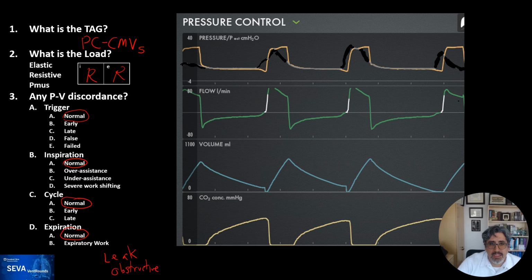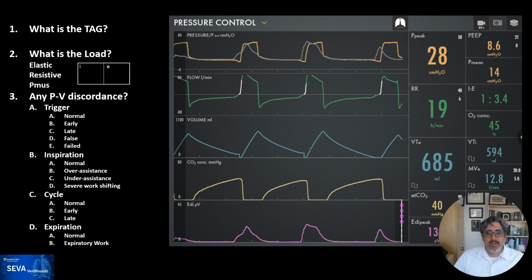So that's probably what I would have said, actually what I said, because I did see this patient, but now I'm going to disclose to you, and your eyes will become more privy to a lot of other data. So what you have here is the actual waveform, but now it has over it the overlay of the electrical activity of the diaphragm, and this would be an estimate of the amount of pressure that the ventilator would be delivering if we activated NAVA at the set NAVA level.